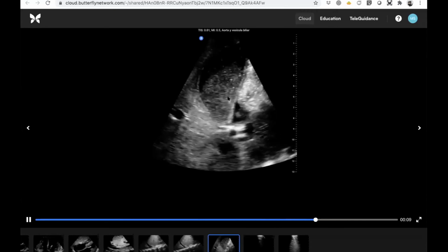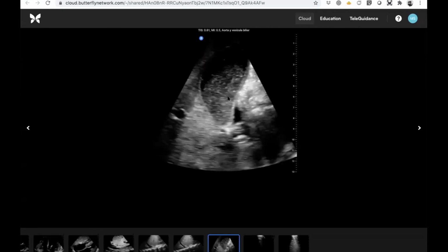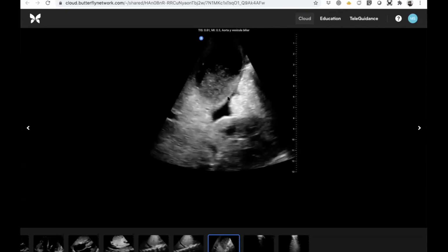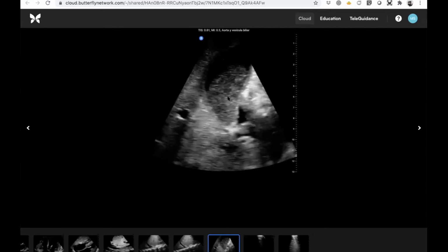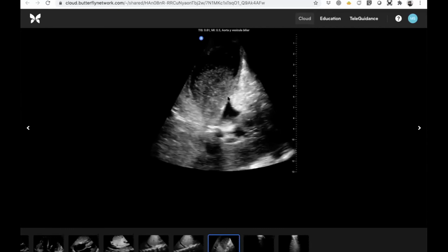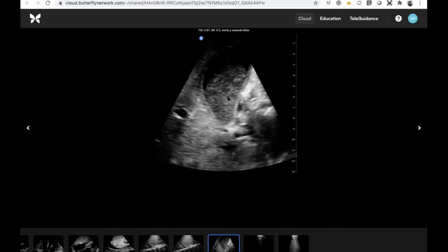And then, is this acute cholecystitis, or is this a patient with gallbladder sludge who also has ascites? Again, we're seeing something in one plane. We haven't measured the gallbladder wall. We don't have the clinical context to know, is this somebody with a fever, infectious symptoms, or abdominal pain? And there are other causes of pericholecystic fluid and gallbladder wall thickening outside of acute cholecystitis. So I'd probably table that and say, I want to know more.